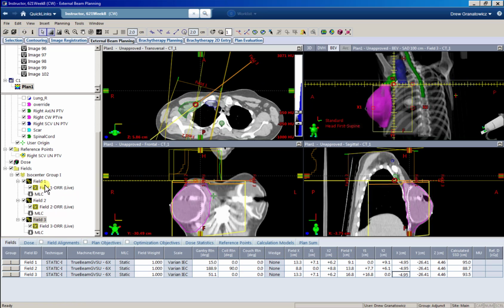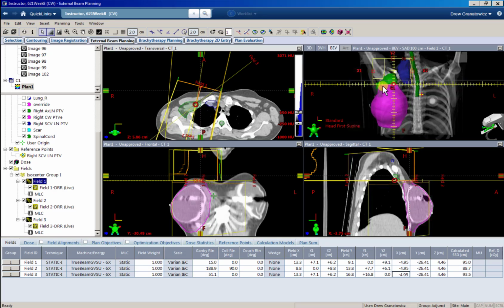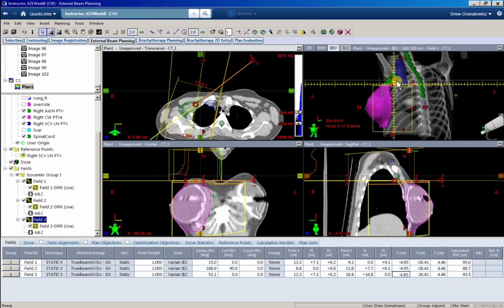So our superclav field is perfectly flat at isocenter down here. Our jaw is set at 0. They're going to be perfectly matched to our tangent fields right here with this Y2 jaw set to 0. So they should be perfectly matched, and we shouldn't have any hot or cold spots. That's a monoisocentric technique.